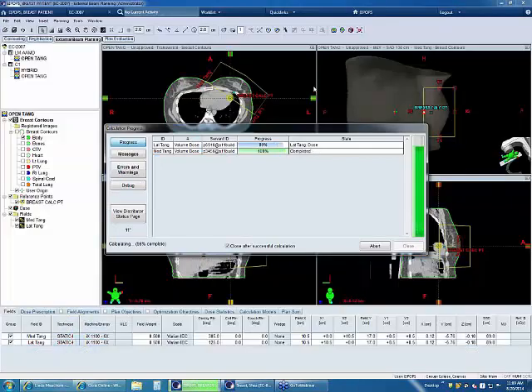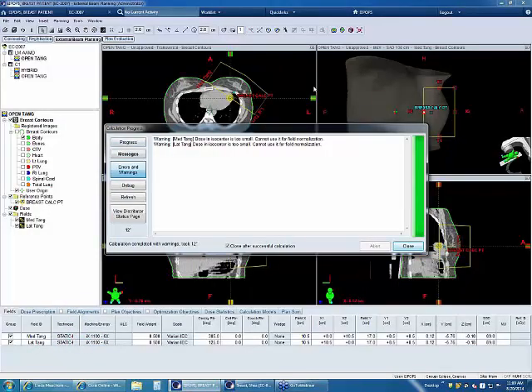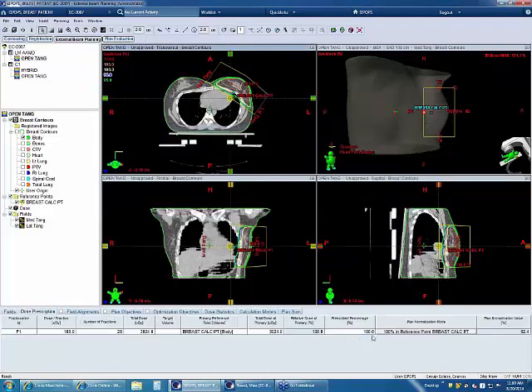I also have a calc point in there because it is set up split beam that's 2 cm away from the ISO, but I'm still going to get a warning telling me that the dose in the ISO center is too small, and that is correct, it is. So I'm going to close that. But if I come down to my dose prescription tab, you'll see that I put it in the reference point, 100% in the reference point.